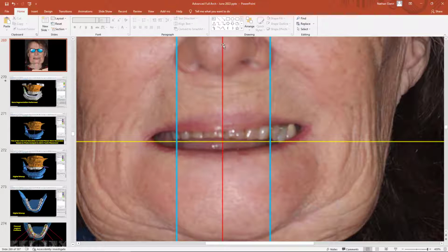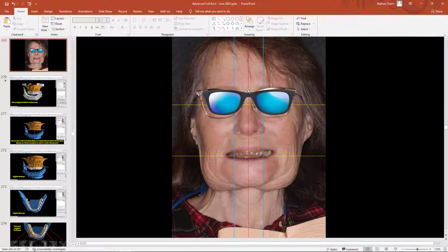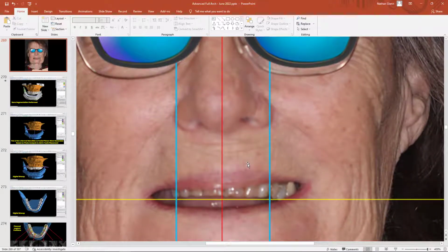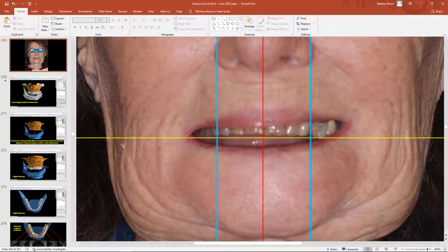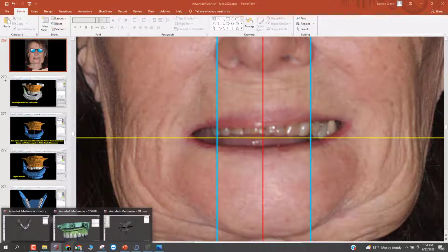All right. I can also tell here, based on this, that this is her facial midline, right? I'm going directly through the bridge of her nose and then right through the philtrum of her upper lip. So based on this, this is what I'm going to have in my mind, and I can reference back and forth as I'm trying to set this plane. I want my horizontal component to be going here and the vertical component going here. All right, so let's jump back into Mesh Mixer.